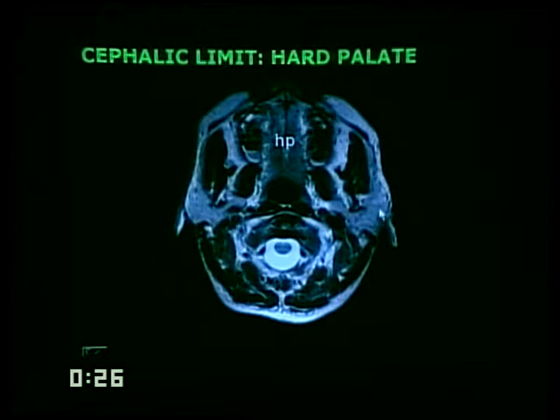Remember, parotid gland lesions are the number one missed lesions on MR or CT of the neck, most commonly because they are just not included in the field of view. You are legally obliged to evaluate the entire neck from the parotid gland to under the aortic arch. Do not stop at the level of the thyroid gland. Do not stop at the level of the thoracic inlet.